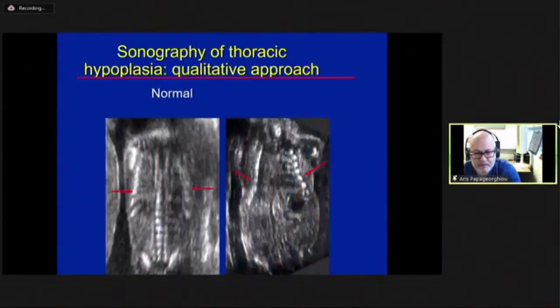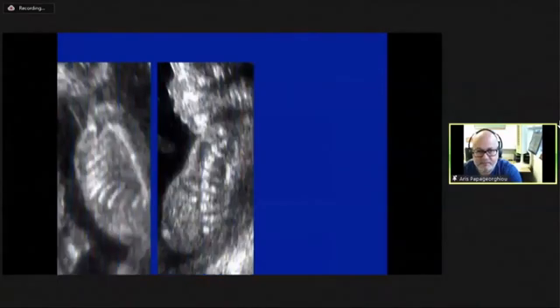and that very redundant soft tissue. And then when you go into the coronal plane, you can see that instead of having that nice rounded shape of the ribs that you normally expect, you have the ribs squeezing inwards. It's been described as a champagne cork. I'm not sure that that's necessarily a very good description.